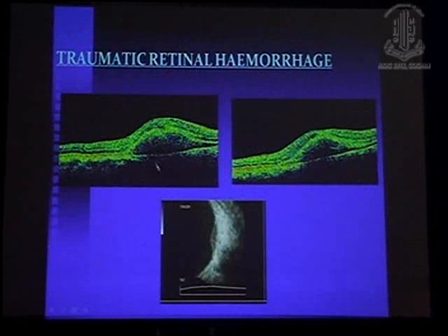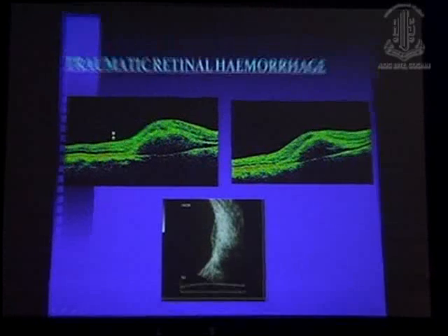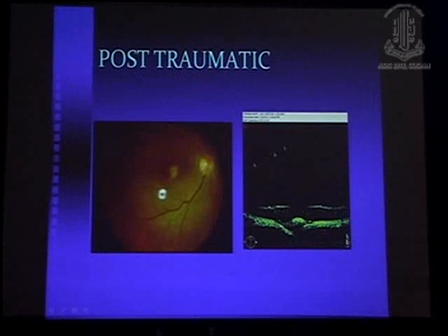Now, in traumas again, you know at which layer the effect is there, because if there is a bleed over there, you really don't know which layer is getting affected. And on the USG, you can make out an elevation, and this tells you whether there is any underlying pathology other than the serous detachment and the status of the RPE.